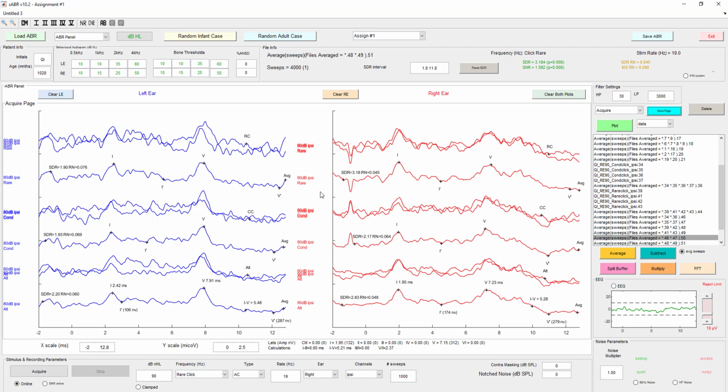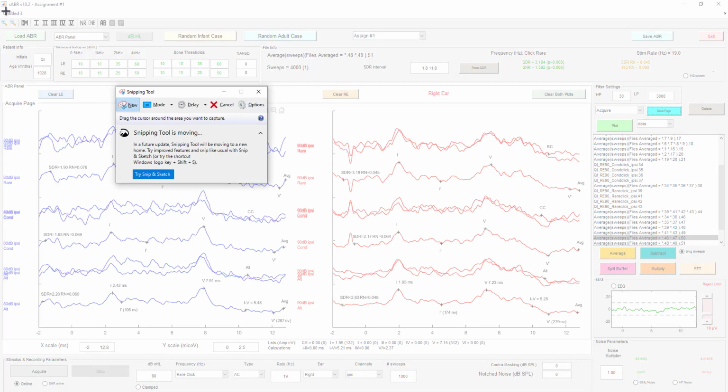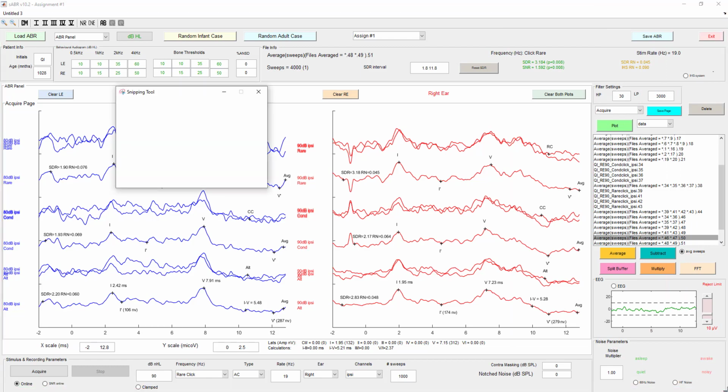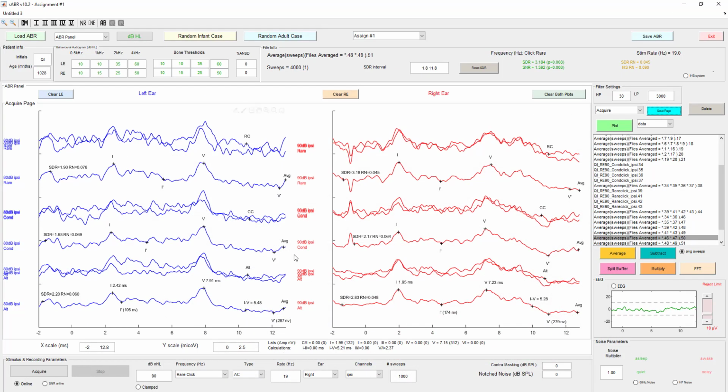directory. Other thing that can also be done, you can use snippet tools or snipping tools, and just go ahead and click on snippet, and you can select the screen, and then you have your waveforms printed out, and you can go ahead and save that into some file. Okay. So once that's done, what I'll do is I will pause the video here and load up what the student will then send to you.